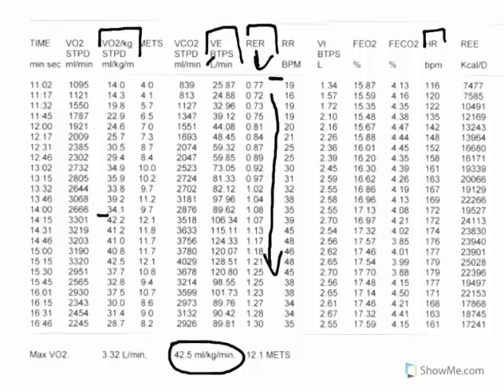But you can almost tell if we look down at ventilation here. I looked at it before, now I'm going to have to find it. It's increasing 32, 39, 44. It's increasing about 4, maybe 5 liters per minute. And somewhere here you have a spike between 59 and 73. So now you've got a 12 liter per minute increase in ventilation. Around there is probably Curtis's ventilatory threshold.